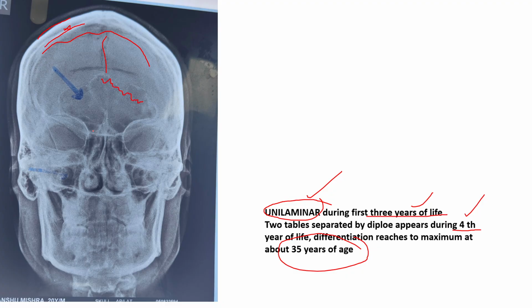This is your frontal air sinuses, crista galli, cribriform plate, nasal septum, the middle concha, the superior concha, the part of labyrinth of ethmoid, the inferior nasal concha, the orbital margin, the lesser wing of sphenoid, the greater wing of sphenoid, the petrous temporal bone, the zygomatic bone, anterior nasal spine, area of hard palate.